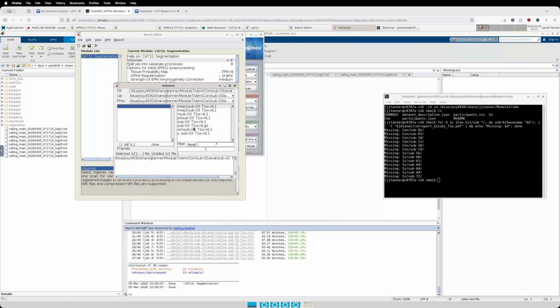A little bit different files in there, but here's this .nii. I'm just going to, instead of doing the compressed file again, do the uncompressed file. That'll save a little step in the processing. Click on it. That's just a single click. You don't want to put both in there. It might say it can't add that other one in there. But again, only do that one.